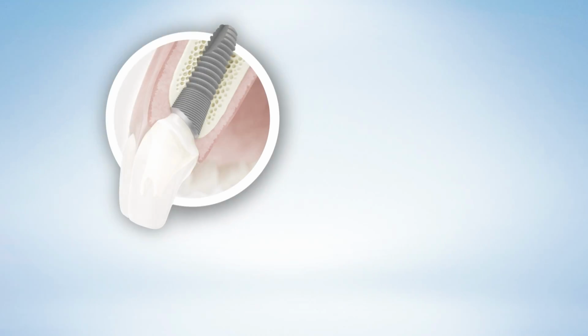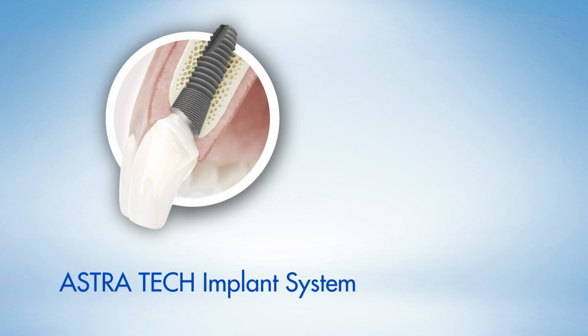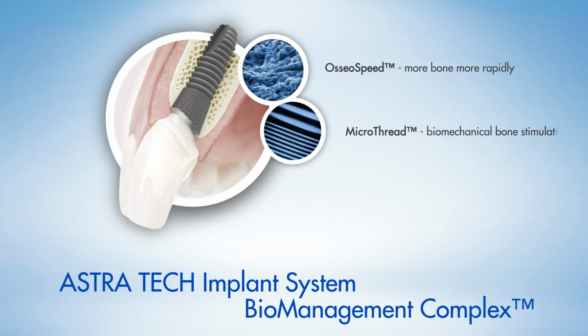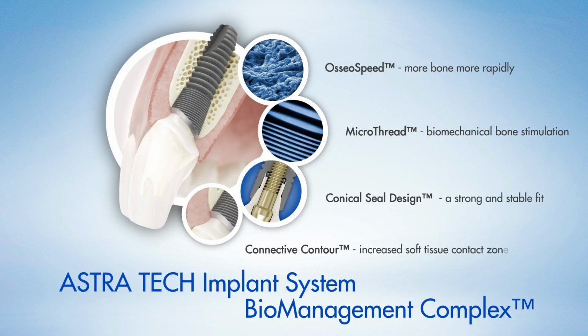The basis of OsseoSpeed Profile EV is the well-documented AstraTech Implant System Biomanagement Complex. This unique combination of interdependent features ensures reliable, predictable, and aesthetic results.